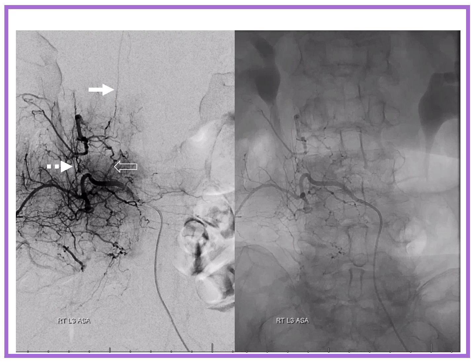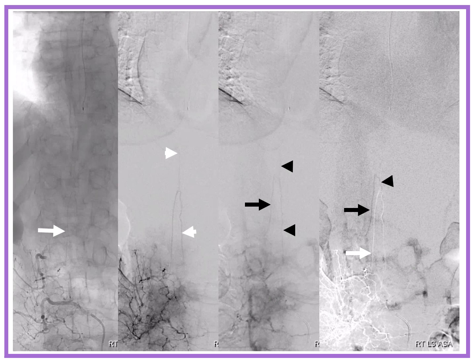Generally, the more proximal the anastomoses are, that's how you can figure out where they are. Proximal means in front of the vertebral body. The more distal you are on the segmental vessel, the more lateral or posterior you're going to be. So here it is. We work it out a little bit more.